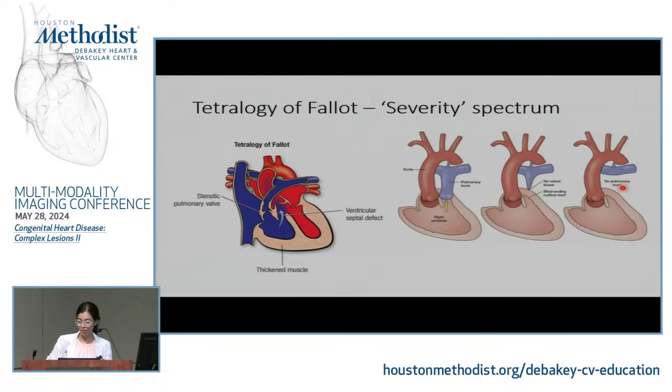And then we have, on the other extreme, patients who may not have an MPA, a main pulmonary artery developed. And you may have patients who have discontinuous branch PA. So here, these are continuous, right? The LPA and RPA are talking to each other. But we have patients who have discontinuous branch pulmonary arteries. And then we have patients who don't have identifiable pulmonary arteries at all. And what feeds the lungs in those patients? Collateral vessels, and what do we call them?